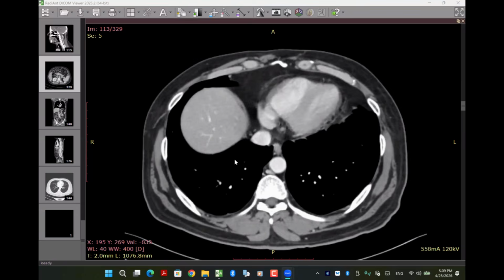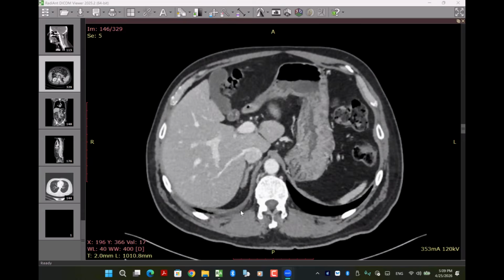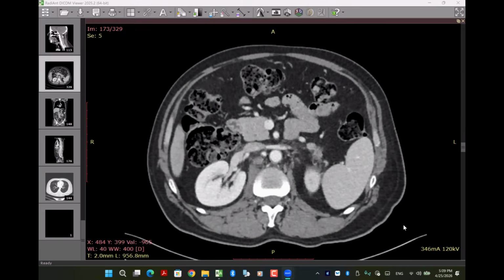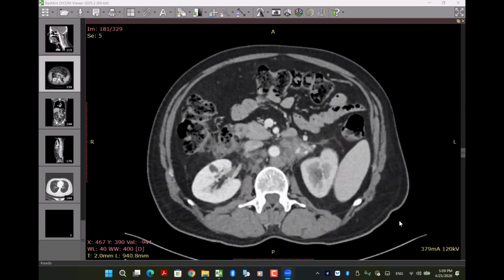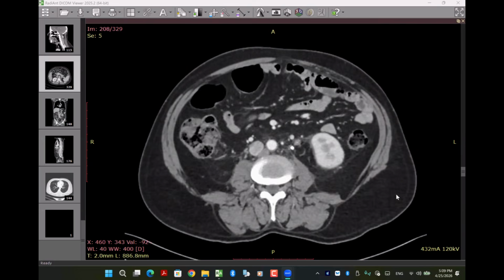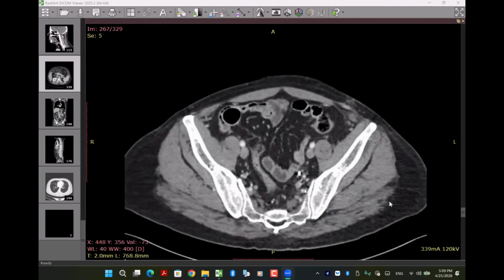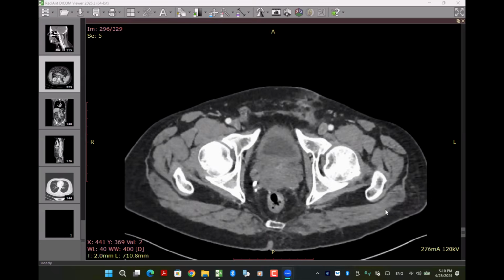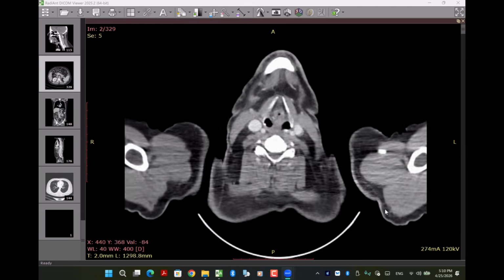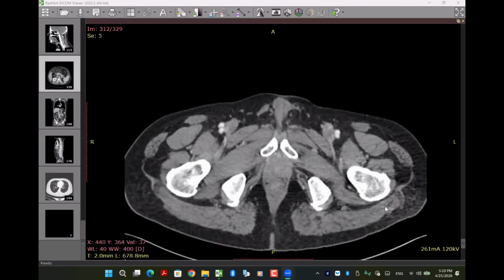I'm provided with a CT scan of the abdomen in post-contrast images in axial view. I'll first quickly scroll through the stack and go to the last image, and then I will give my findings. I'm going to the last slide, and okay, now I will scroll back up. Go back, yes, because this was chest, abdomen, pelvis. Okay, I'll go back.